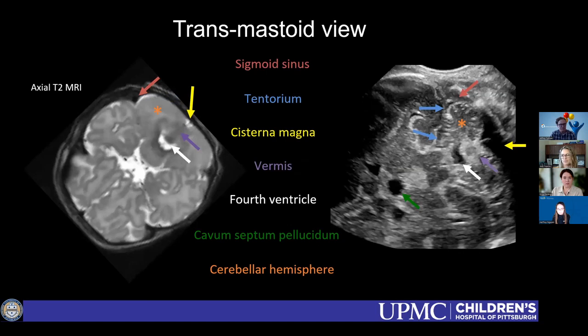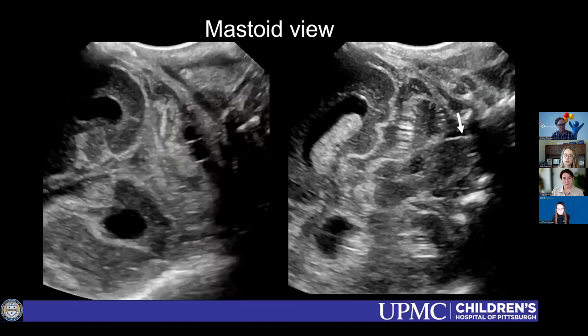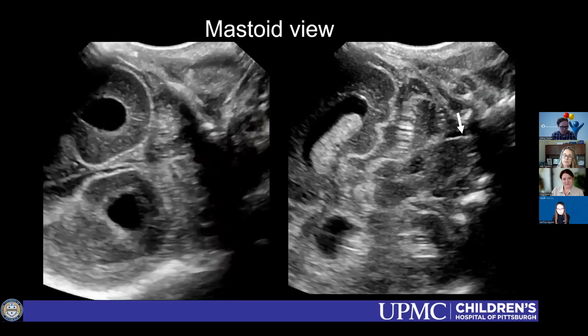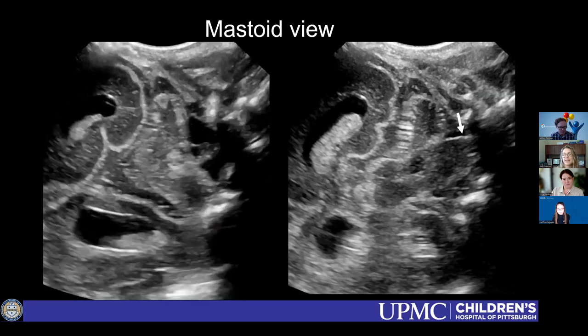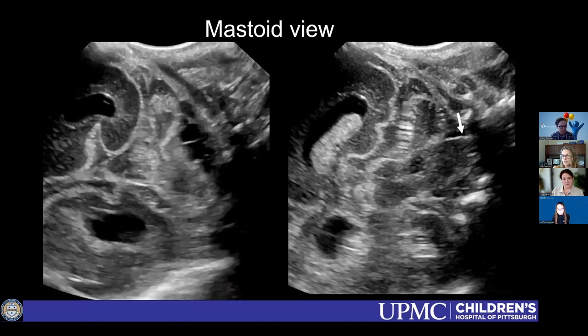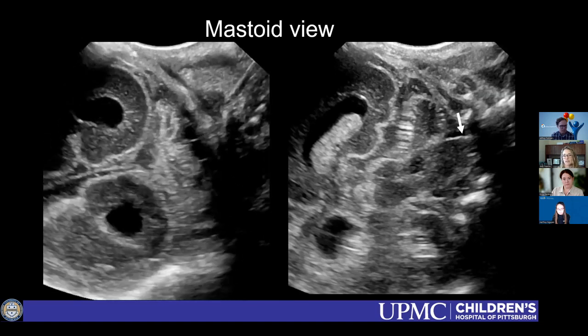Just a quick reminder, this is the view most people are confused by. It's maybe newer for some people reading head ultrasounds, but you can see all of the posterior fossa and deep anatomy beautifully. I love cines also because it's a good time to look along the tentorium, along the hemispheres of the temporal lobes. And then you can also even see brainstem structures. And if there's a question for posterior fossa cystic spaces, I find this view super helpful, especially if they give me cines.